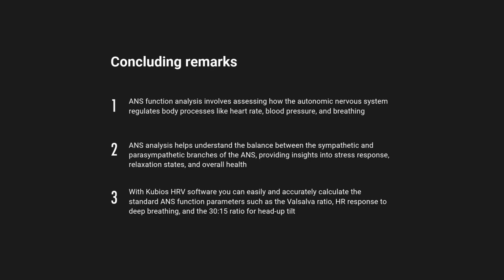With the Kubios HRV software, you can easily and accurately calculate the standard ANS function parameters, such as the Valsalva ratio, HR response to deep breathing, and the 30-15 ratio for head-up tilt.